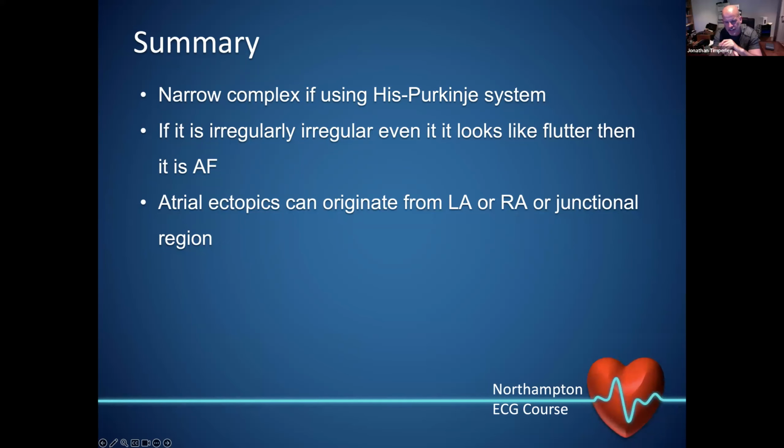You do see that, and ultimately, if you have something that does not map into something that would fit an atrial flutter, be it a 3-to-1, 4-to-1 block, whatever, it can't be anything else apart from atrial fibrillation.